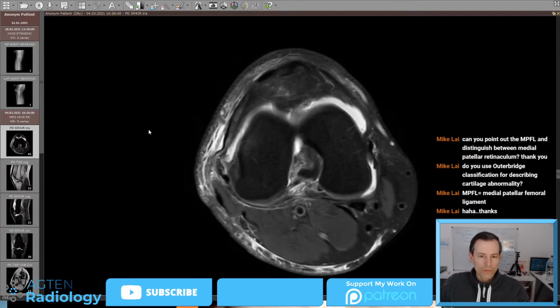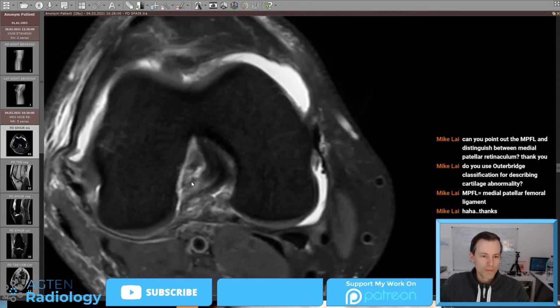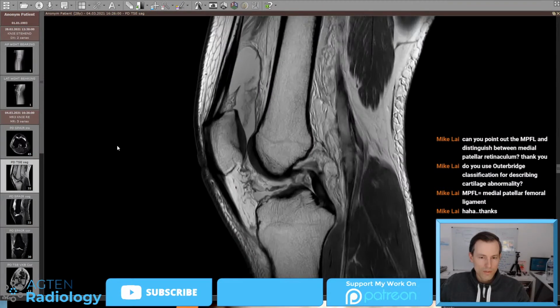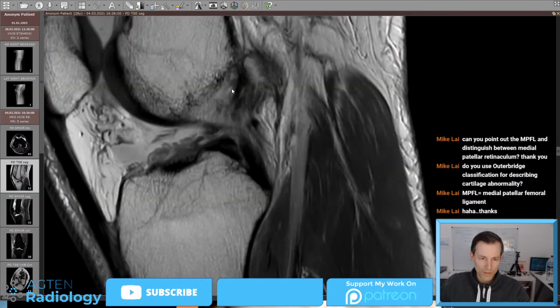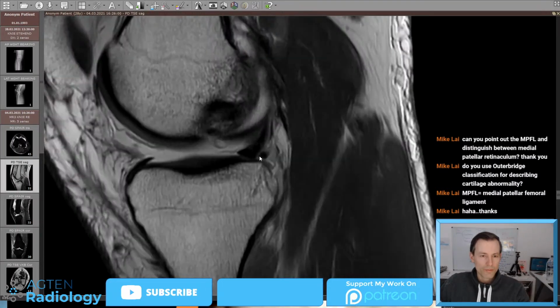And I like the transverse sections quite a lot. We see a little bit of ACL up here, then it's completely gone, then some things are coming down here, then we have this irregular structure here, which we will have a look at in a minute. The sagittals are also very good in this case. You can see the distal portion, and then a little bit up here, and the rest is completely gone. As for the PCL, for me it's a bit too high signal here, so maybe mild injury of the PCL here as well.